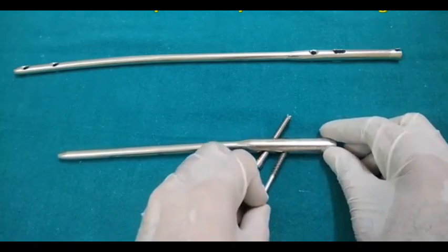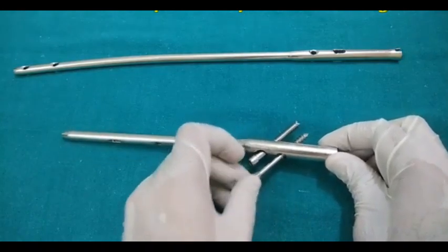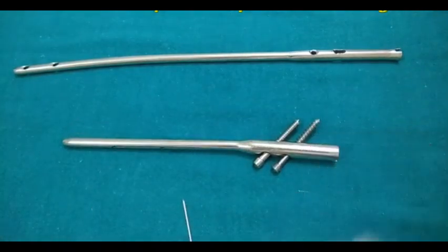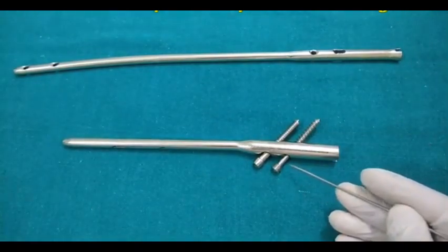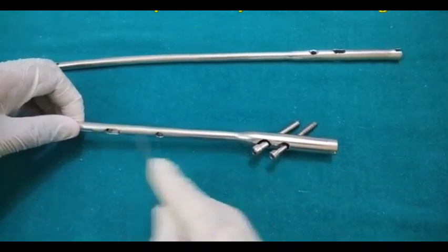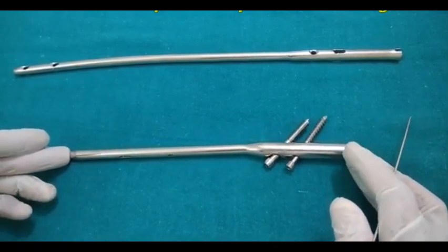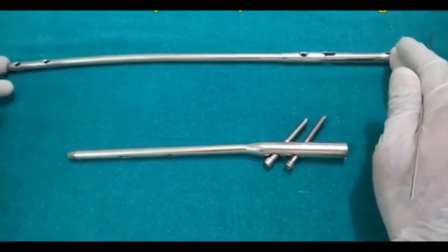This is not actually the screw of this, but I have just shown it to you. There will be two screws in the proximal fragment. This is the medial side, this is the lateral side, and this is of 6 mm and this is of 8 mm diameter, and again there will be two holes for the interlocking in the distal. So this is actually a short PFN. The size or the length is small. The long will be the same as the femoral nail. The size will be the same.